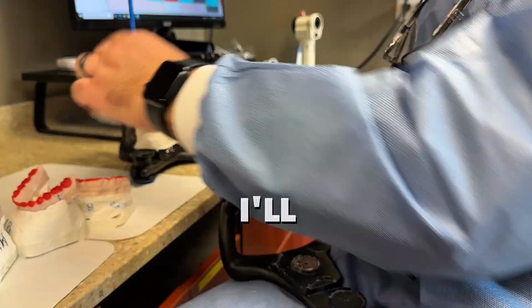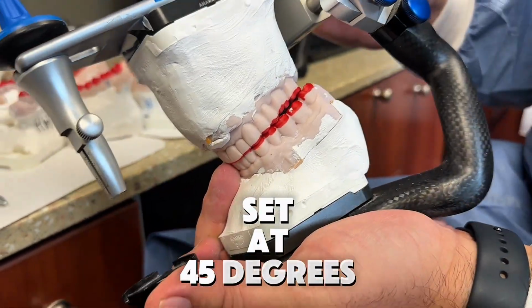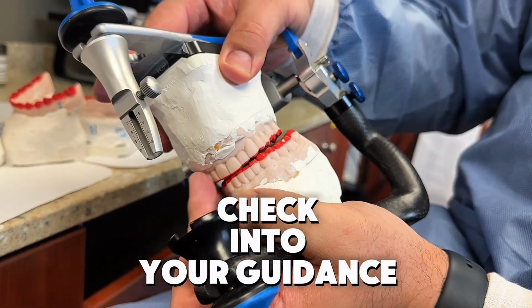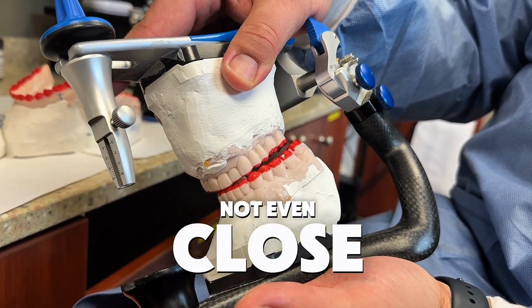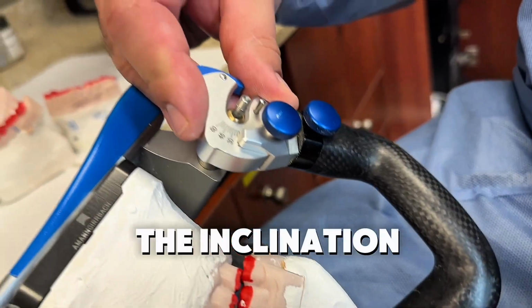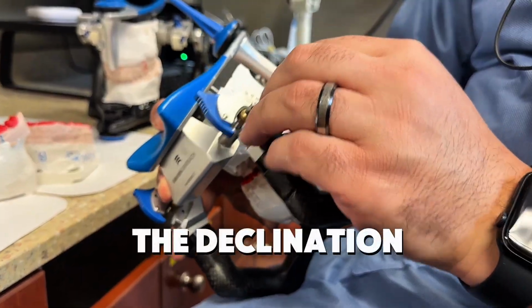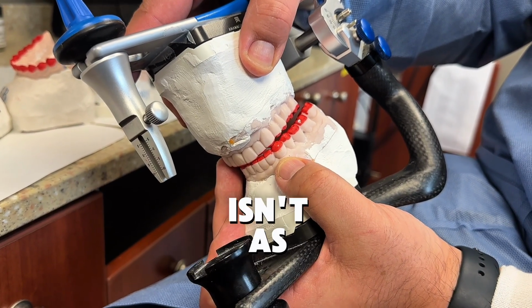I want to show you this one again. I'll show you her case quickly. There's Mr. Hassan. So we have inclination set at 45 degrees. If you move laterally and you want to check anterior guidance, look at that beautiful anterior guidance. Look how the teeth are nowhere near touching. Not even close. No interference whatsoever. That was on 45. You change the inclination to 10. I'm just trying to exaggerate the inclination. When you move laterally, you're closer. See how the space isn't as big anymore?